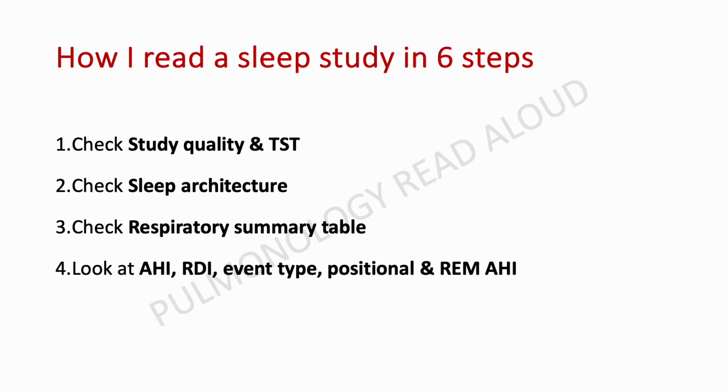After that, I put my eye on the indices, and indices are very important, yes, but it's not only the apnea hypopnea index. I would want to see the respiratory disturbance index. I would want to see the PLMI. I would also want to see REM related AHI, and other problems specifically in position as well as in the REM stage of sleep. So that is something that I would next look at. After that, it's important to look at the desaturation burden.